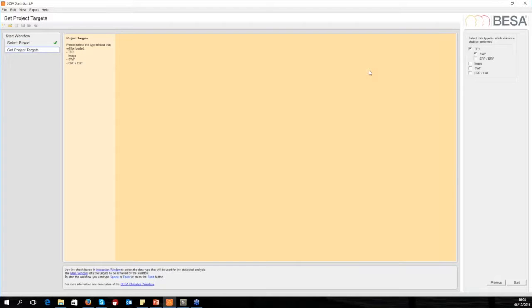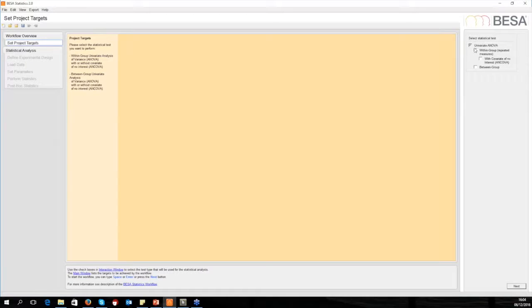I'm now interested in the auditory processing of more complex auditory stimuli. So the subject listened to in-tune chords, to out-of-tune chords, and to chords where just one of the chord components was delayed. There's a source model for the processing, and a time-frequency decomposition was done. So that means we need to select the data type as time frequency source waveform and start the workflow for this.